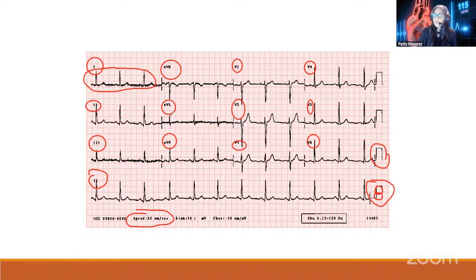If it's faster, then your EKG is going to look different. It still gets the information, but it's just faster or slower. And if your voltage is smaller, your image is going to be, it's like when you're zooming in or out.